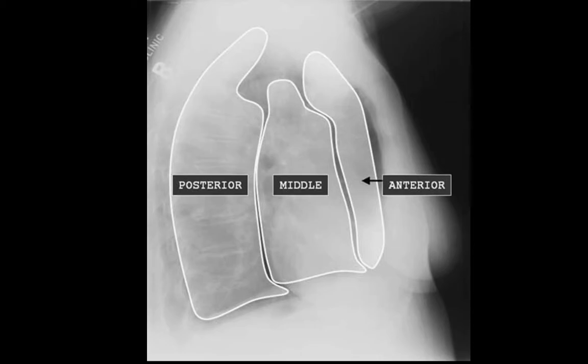We know from our anatomy that this is the anterior mediastinum, this is the middle mediastinum, and the posterior mediastinum.